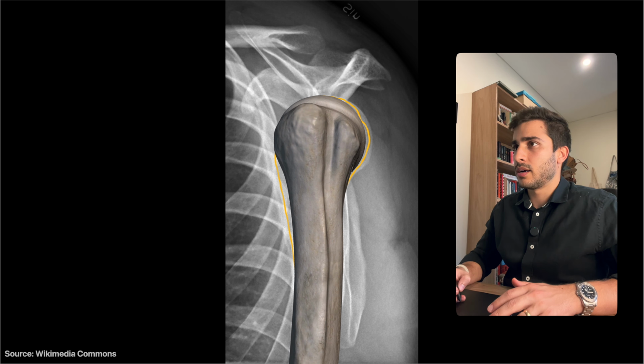Now, ideally in shoulder lateral positioning, you get the patient's hand like this and the humerus out of the way. In this case, it looks like the humerus was close to the body and therefore overlapping the scapula. And by the way, the reason it looks like a Y-lateral, I'll show you on the anatomy app so it makes sense. Okay, so here we have the anatomy.